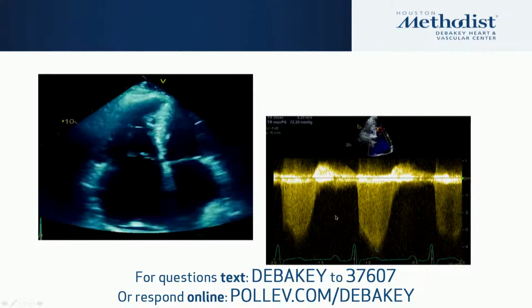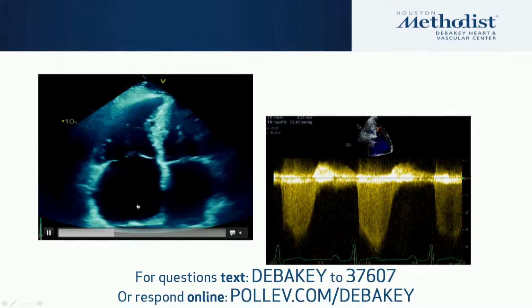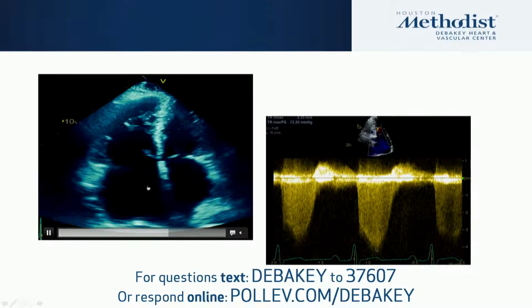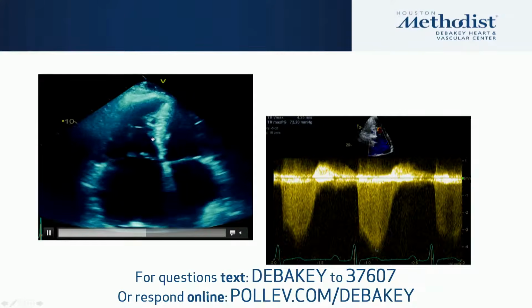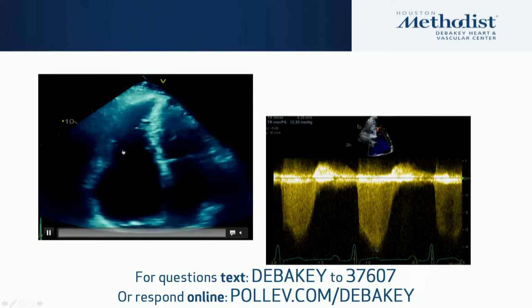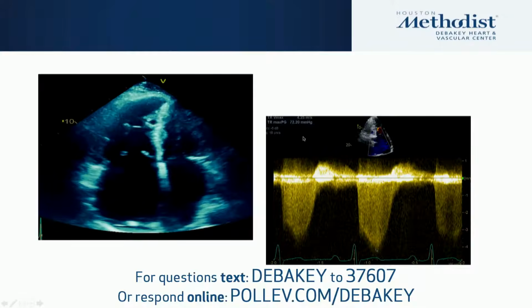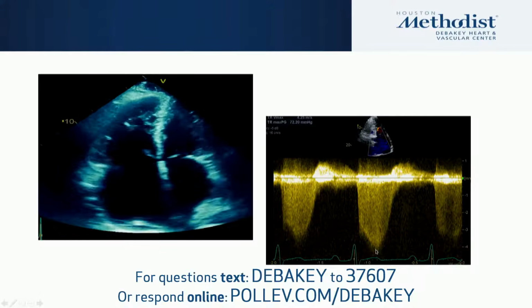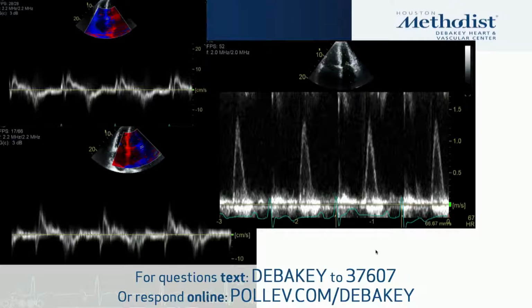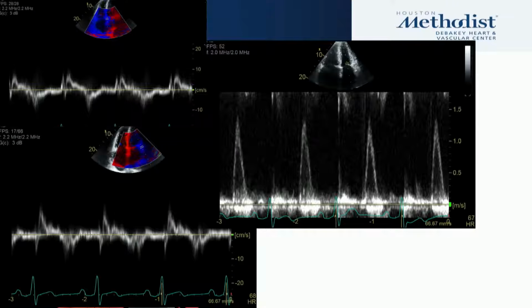Now, looking at the four-chamber view, we still see that small posterolateral pericardial effusion behind the right atrium, the severe biatrial enlargement, the LV with normal function, and the RV that's dilated with depressed function. The TR velocity was at 4, and the RVSP now is at 70, which is consistent with his history of severe pulmonary hypertension. Diastolic dysfunction is very important in these patients.